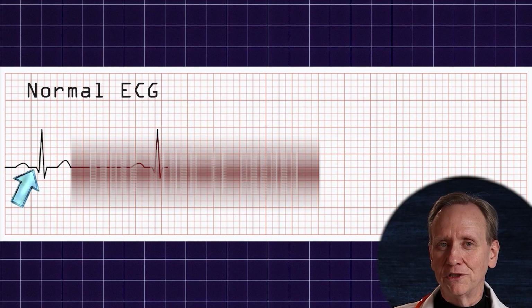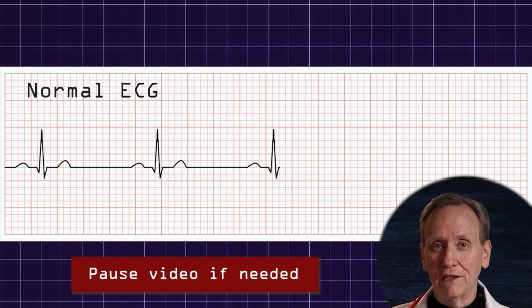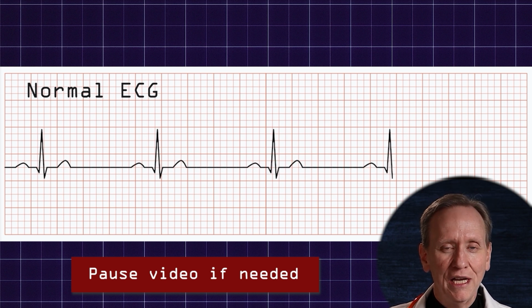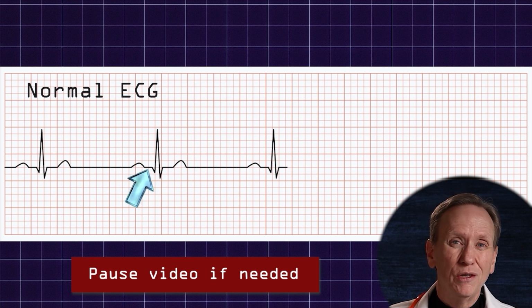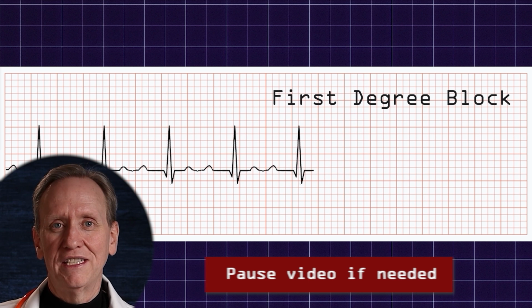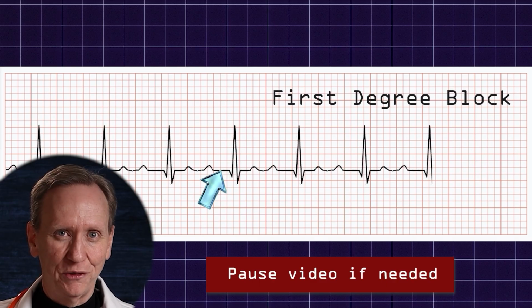As you look at this, what you'll see here is the distance between the P wave, and I like to look at the end of the P wave. Technically, you're supposed to look at the middle or the start of the P wave. It's called the PR interval. That definitely gets a little bit nerdy. But the distance between these two parts is supposed to be really only just a couple of those small boxes wide. But if this gets to be greater than that, if it gets to be somewhat of a distance between the P wave and the QRS complex, then that's when you have a first degree block.